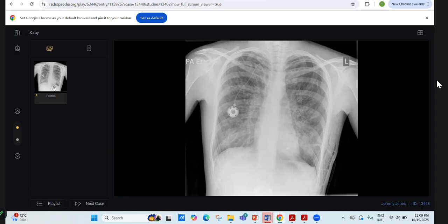I'm suspecting a thin linear area of pulmonary pleura along the left lateral chest wall, concerning for pneumothorax, and bilateral apices are also devoid of bronchovascular markings. Concerning for bilateral pneumothoraces, I would immediately contact the referring team or emergency department from where the patient has come, to sort out after a detailed history.